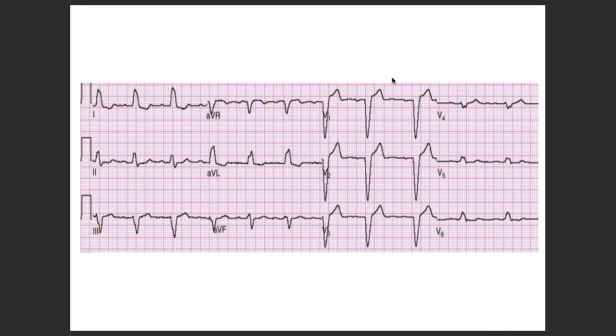That's good. I use the calculator. I can't actually work out 325. The best way, of course, is to zoom in, and you can always count those boxes as well. Multiply a little bit; the calculator is the best way to be precise, in fact. That's one of the reasons as well: never depend upon the explanation on those machines. Humans are smarter. Always remember that. Trust yourself.